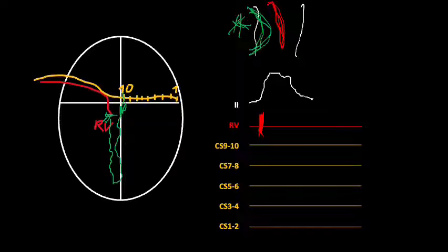So in general, the distance between the artifact of the pacing and the activation of the atrium is quite big. And this is the time which corresponds with the time of conduction through the muscle and then through the conductive system.